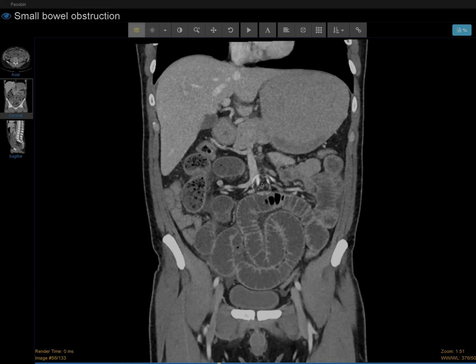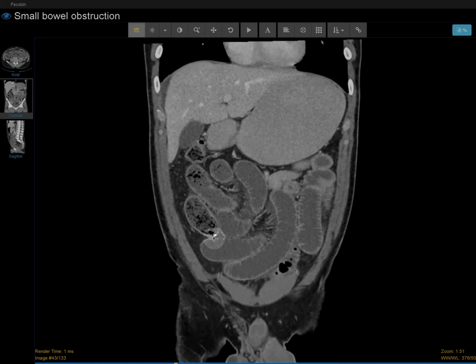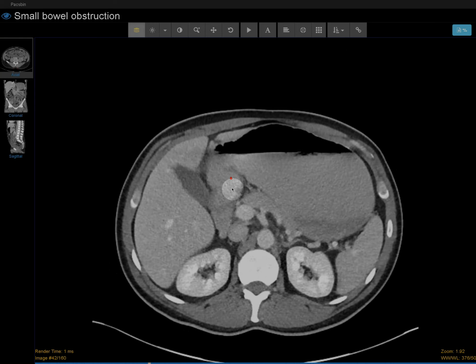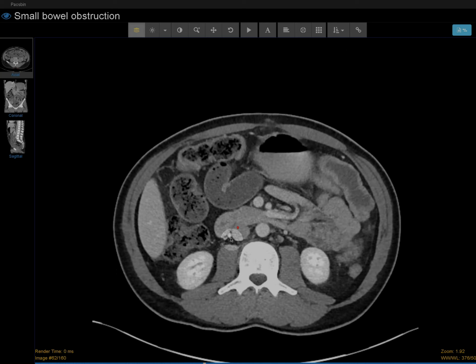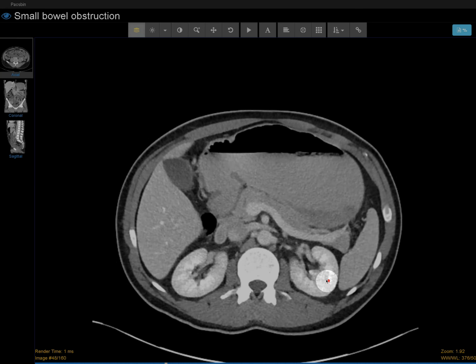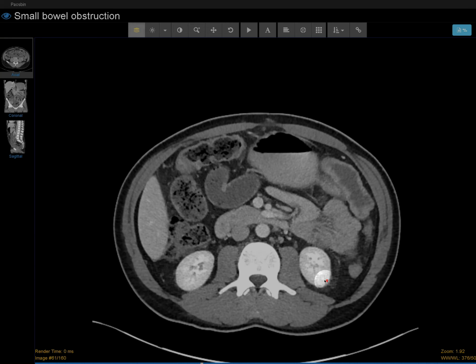So the main problem I identified so far is small bowel obstruction with transition point at the enterostomy in the right lower quadrant. And here we can see too, it would be right there. And at this point, I'll just follow my search pattern just to make sure there's no incidental finding. Liver, gallbladder, spleen, pancreas, adrenal, kidney. There's a tiny, I would probably call it an angiomyolipoma just because it is fat in density, and a renal lesion that's small with fat density, we can safely call it angiomyolipoma.